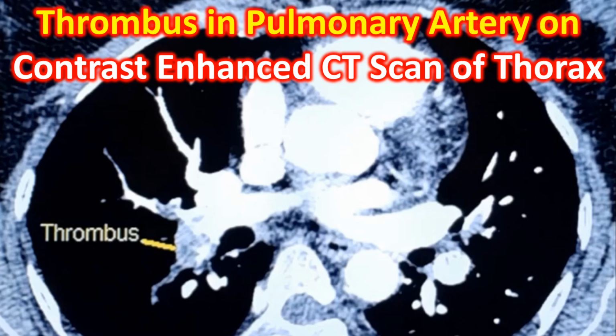Usually when pulmonary embolism is suspected, we only find evidence of dilatation of right-sided chambers and increase in pulmonary artery pressures by echocardiography being a bedside tool.